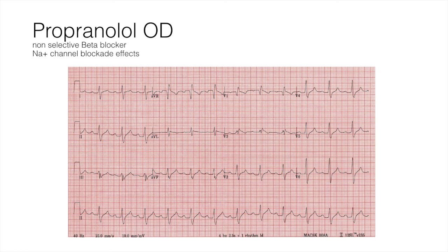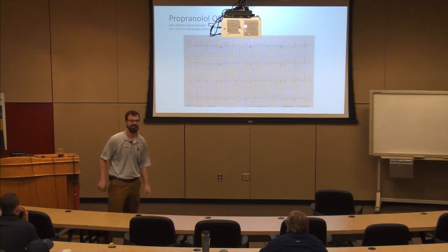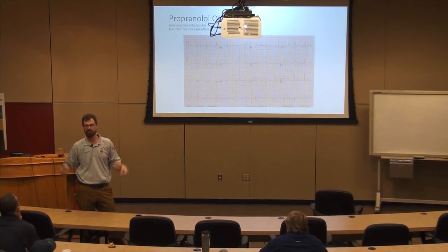I would. Yeah, this is a sodium channel blocker. I'd treat that. I'd give her bicarb for sure. Absolutely. Because remember, we have a tricyclic protocol, right? But what's tricyclic? Tricyclic is sodium channel blockade. We should rename the protocol the sodium channel blockade protocol, right? But then no one would know what the hell we're talking about, right?